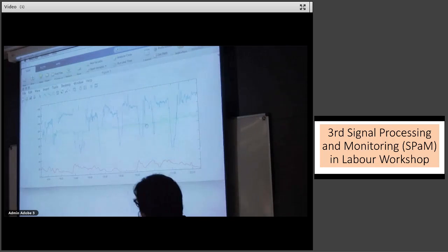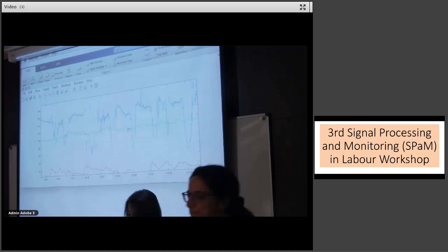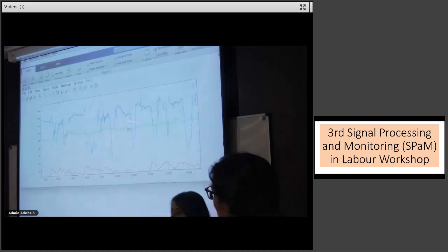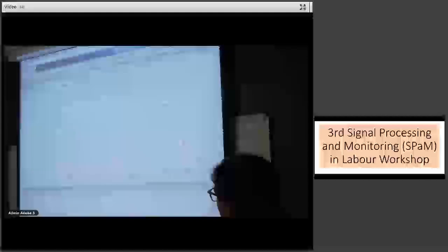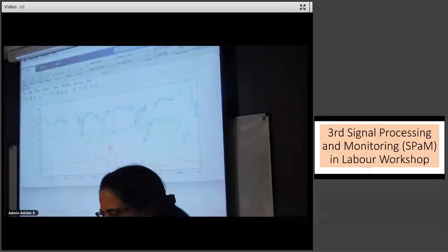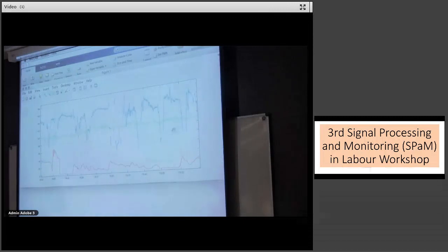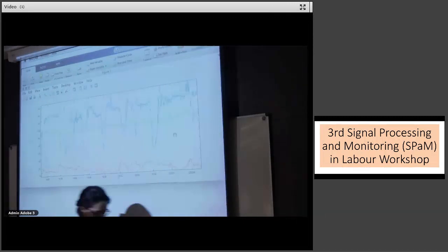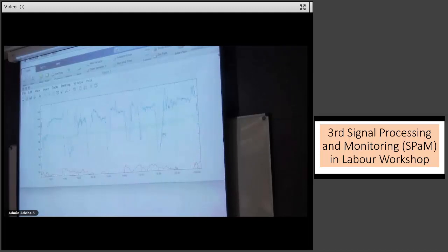Yeah, that's fine. Before the dropout, was nobody concerned about late decelerations? Seems no. Do you think they're late? Right before the dropout. This pattern here, I think what you're doing is you're giving the morphological description of a late deceleration. In other words, what you're saying is the peak of the uterine contraction. Yes, so onset two minutes after the contraction. Yes, that's worrisome. In my experience. That's what I'm trying to correct.